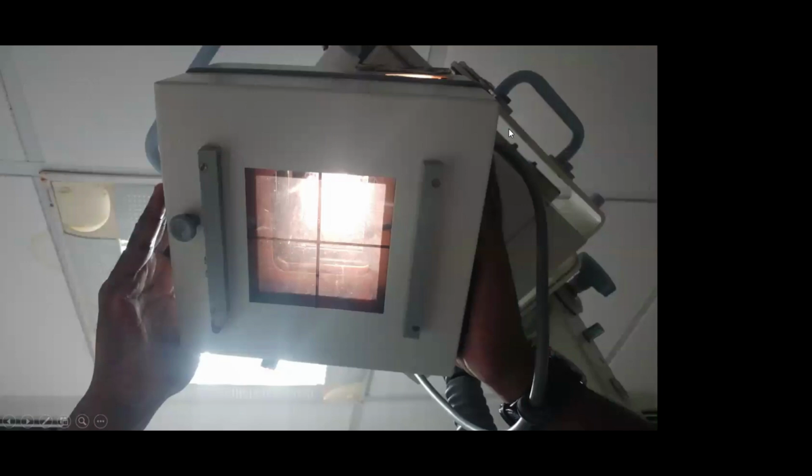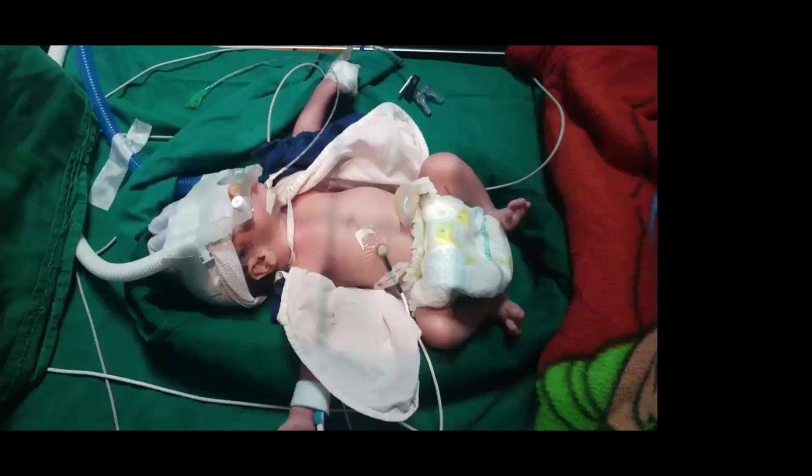If you see the previous one, there are a few buttons on either side, which can limit the amount of radiation exposure from both sides. So they can limit the amount of exposure from up and down or from side to side, to see to it that the radiation field comes just to the outer margin of the chest. If you don't want to take the abdomen, then just expose the upper 1/3.